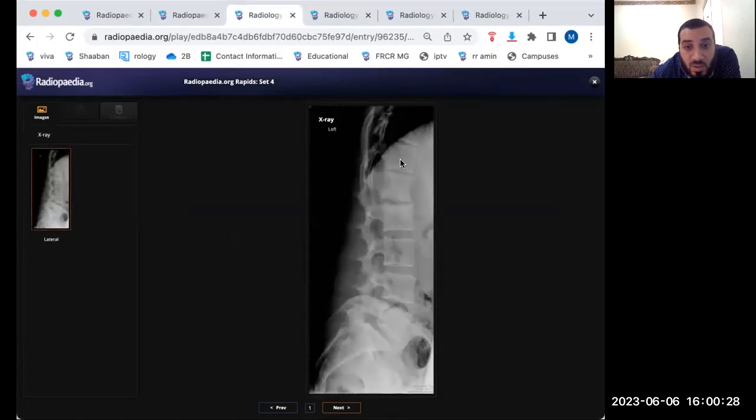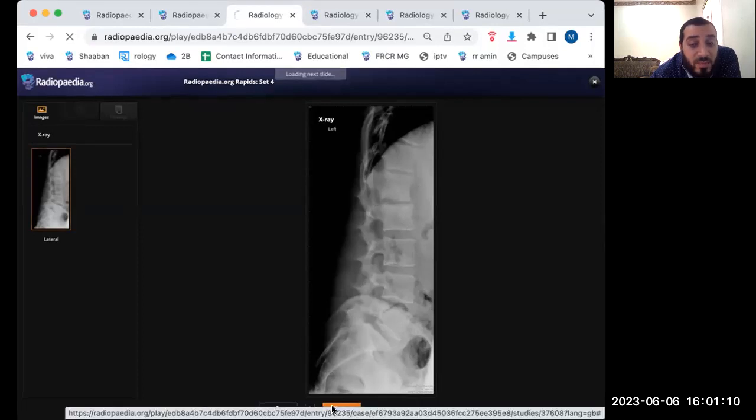This one, as I told you, compression fracture, L5 pars fracture, or sacral fractures. Here, it could come in the picture that there is sclerosis of the end plates and loss of the joint space. Sometimes on the AP view, you can find a paraspinal collection or mass. So you will go for spondylodiscitis and ask for MRI, things like that. But in the exam, I think it is very difficult to bring something like that. But again, if you can see a very obvious abnormality, okay, put it down, but it should be very obvious. No need for any other investigation to call this image as abnormal.